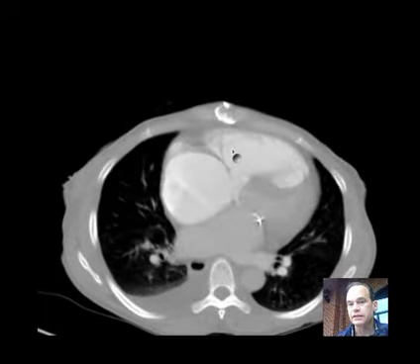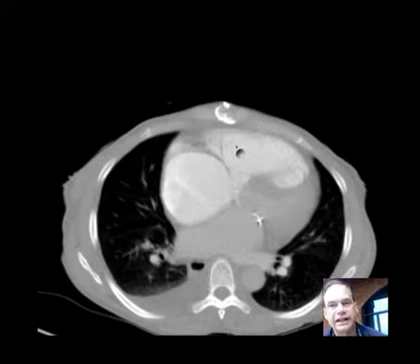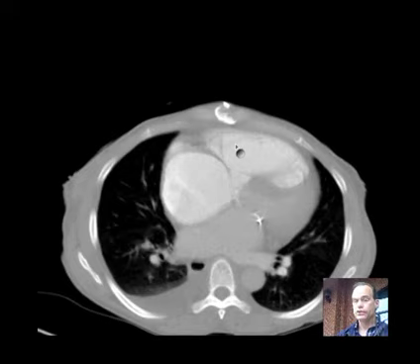But keep in mind that it's very important to look for this finding when it's present, if the patient has pulmonary embolism, because then it can be an indication of right ventricular strain, which indicates a particularly serious prognosis, a bad prognosis for that patient who is experiencing pulmonary embolism. That's all for now.